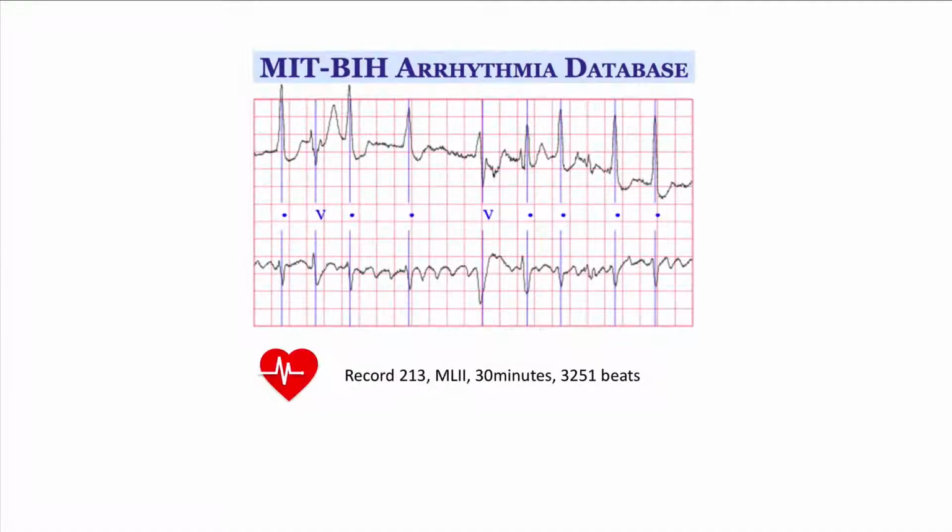In this video, we demonstrate the application of ECGLens by analyzing a real-world ECG record from MIT BIH Arrhythmia database. The record is slightly over 30 minutes long and contains more than 3,000 beats in total.